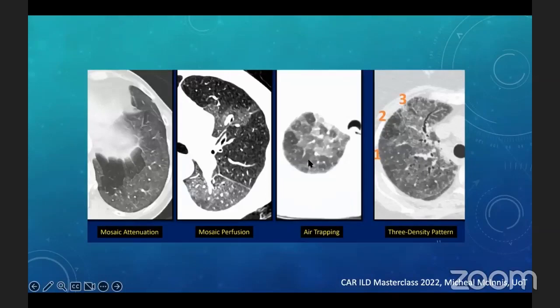How do we know this is expiratory if it's not labeled? Just look at the posterior membrane of the trachea, and you see how it's anteriorly bowed. That is a good expiratory phase. It's really important for the CT techs when they do the scan to ask the patient to really exhale the air as much as possible to reach the end expiration, because early expiration wouldn't really help, and sometimes you will not be able to evaluate the air trapping.